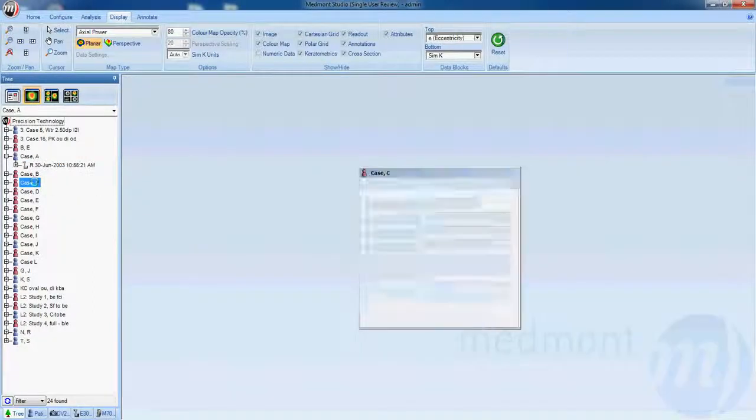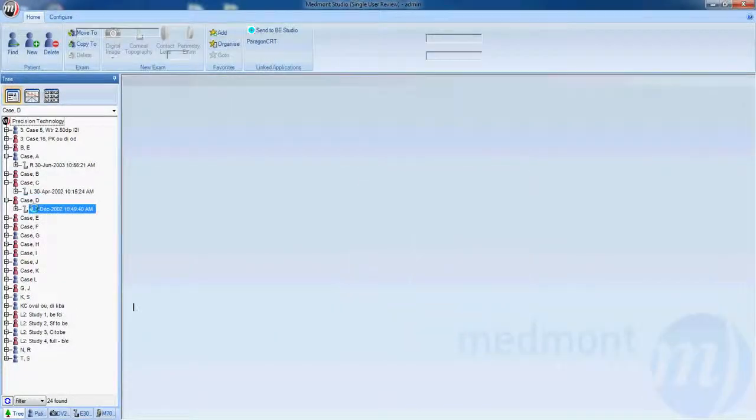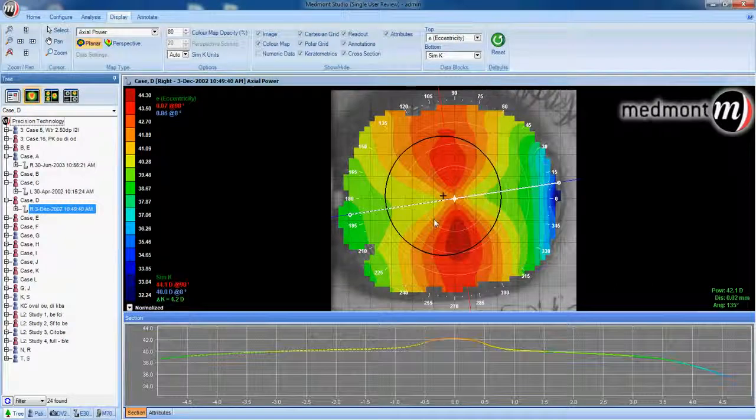Compare that to this particular patient where you see against the rule corneal astigmatism of a very similar amount of corneal cylinder, 1.6 diopters on this against the rule eye. But again, we see centralized corneal astigmatism. Compare this apical or centralized corneal astigmatism to what's described as limbus to limbus corneal cylinder or astigmatism.